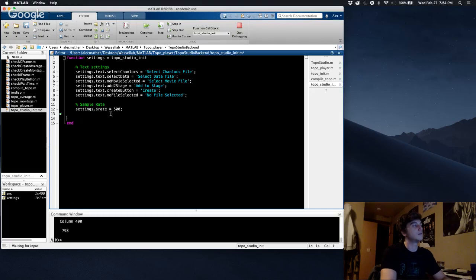No, actually, we need to do that in... actually, let's make a function.